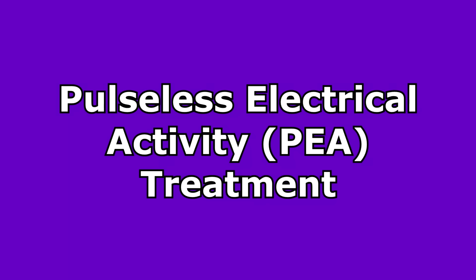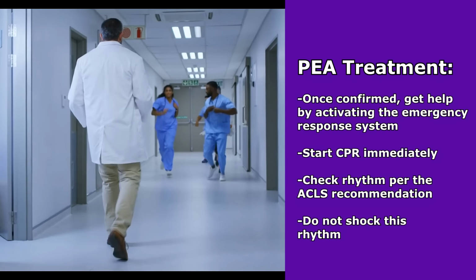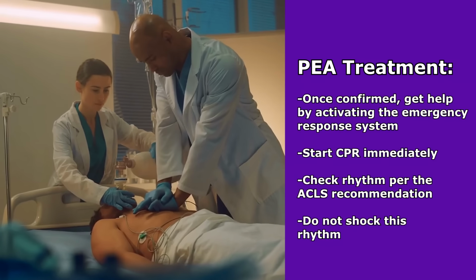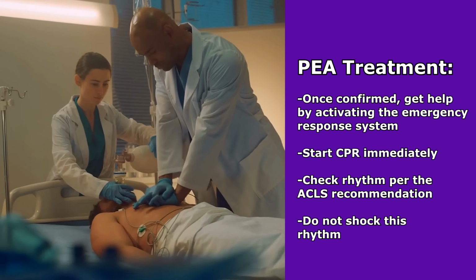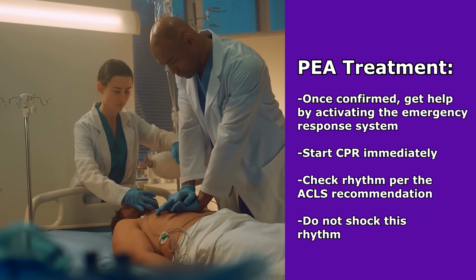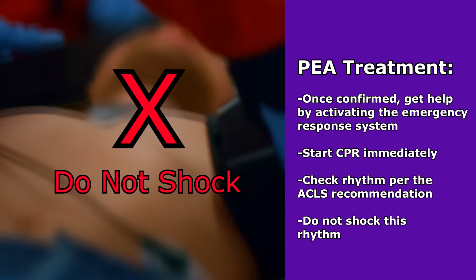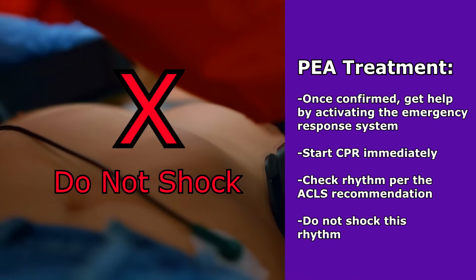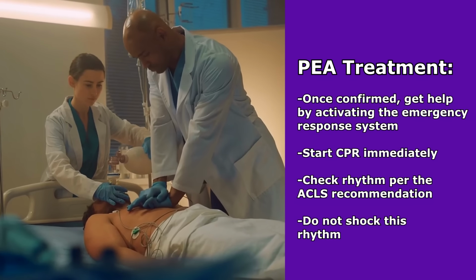Now, what is the treatment for PEA? As a nurse, after you've confirmed that you do have PEA, you want to immediately activate the emergency response system. Call code blue, call 911, and start CPR immediately. You'll be doing CPR, you'll have a team of people helping you, and you'll be doing rhythm checks per ACLS's recommendations to see what kind of rhythm you have. One thing you want to remember about PEA is that it is a non-shockable rhythm. We cannot shock this rhythm, so we'll just continue CPR until we have a rhythm that we can shock.